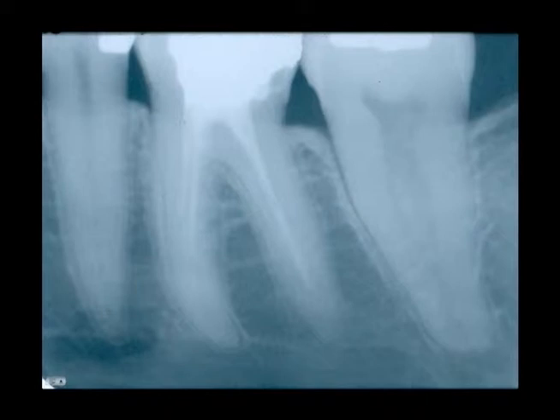Although it does not represent good radiation hygiene, as a last resort, one could obtain another radiograph, and if it is rarefying osteitis, it would remain attached to the apex of the tooth no matter what the beam direction. If it is the mental foramen, it is not proximal or not attached to the apex of the tooth, and with changes in beam direction, the radiolucency would move away from the apex.